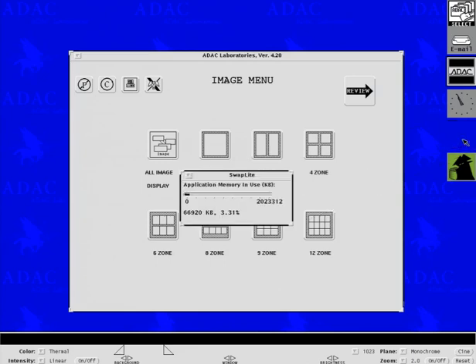The next icon down, little stoplight. What that is, is our swap space. Swap space is hard drive space being used as memory space. If I open lots of icons, have lots of processes running and open as icons, namely if I'm running AutoQuant or AutoSpec Plus, they take up memory space. So each instance of an AutoQuant display that I have up on my screen is chewing up memory space. Eventually I will use up all of the RAM in the system and I will start using the hard drive space as RAM. That actually will slow the system down significantly. So basically you want this number to be low.